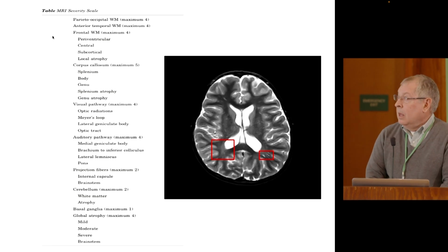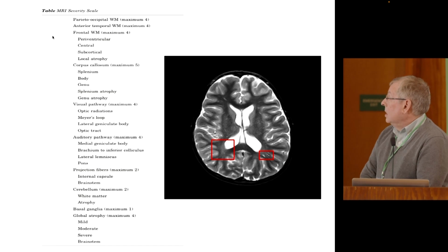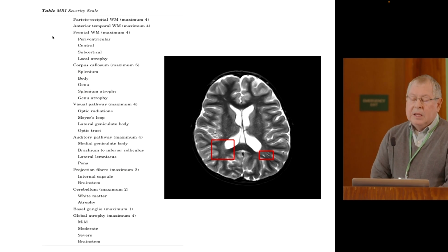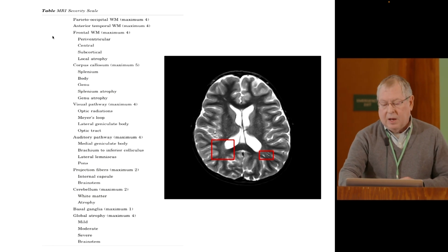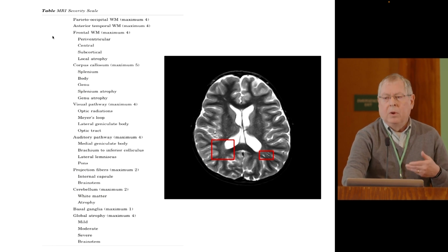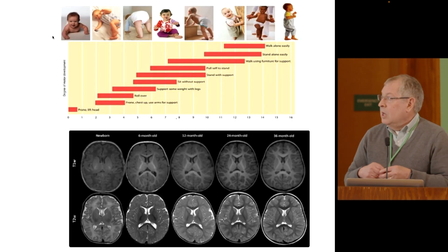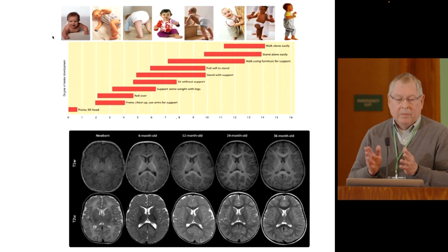Okay. Now, there are some things that don't get scored on the MRI. You see these little, and I put boxes around them. These are normal variants, and these are not getting scored. But then you need to be somewhat familiar with ALD to recognize that. Now, we heard in the last talk a question about how we deal with the myelination. So what is myelination? Myelination is the formation of myelin over the spectrum of development.